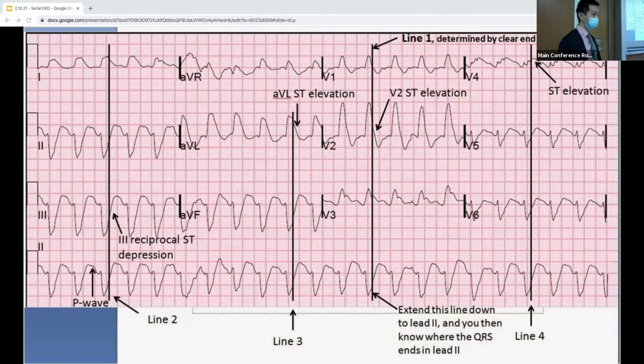Yes, Dr. G. One of the giveaways here, I think, is you look at it and it's bad and you get help. But like you pointed out over there, the other thing is with a right bundle branch block, in lead 1 you should have a big S wave, as reciprocal to having a right bundle, which you have here.